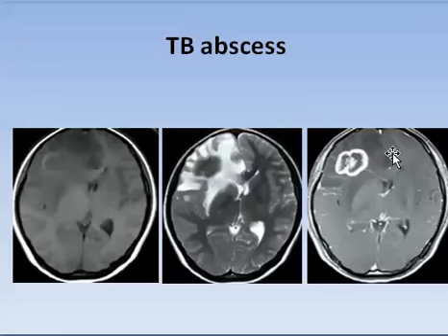Here the area involved is very big due to devascularization or hypoperfusion from associated spasm of vessels, denoting an infarct, and there is a push of the midline a little to the other side. These are all stigmata of TB.